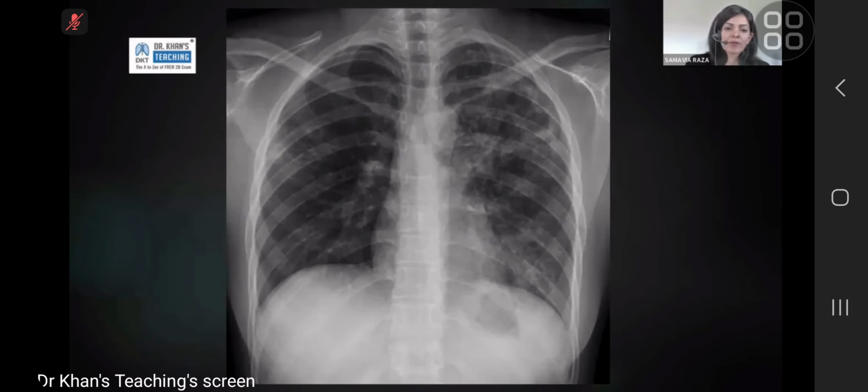They're asymmetrical. If the patient is relatively well in the sense that they are not coughing up blood and they don't look like somebody who has septic emboli, they're not IV drug users, anything like that, then you see this bulkiness around the left hilum. You wonder, is there lymphadenopathy? So you have lymphadenopathy, bilateral lung changes, some of which are cavitating, and the cavitation is more in the upper zones. You have to bring in the differential for tuberculosis or mycobacterium infection at this point.